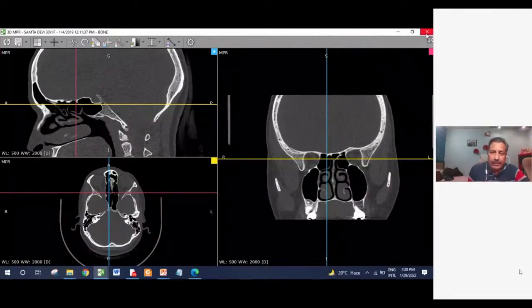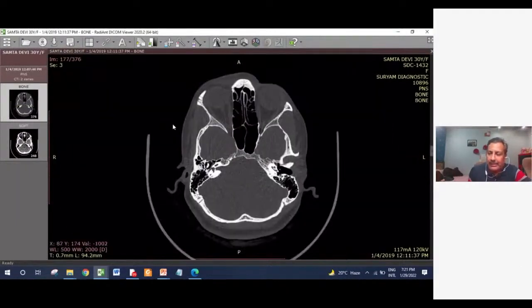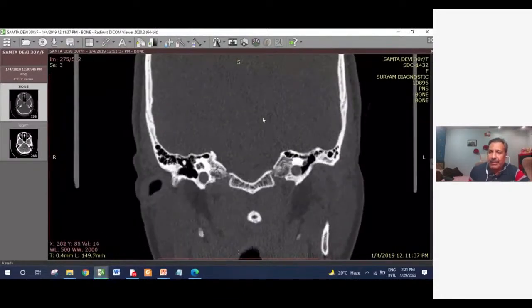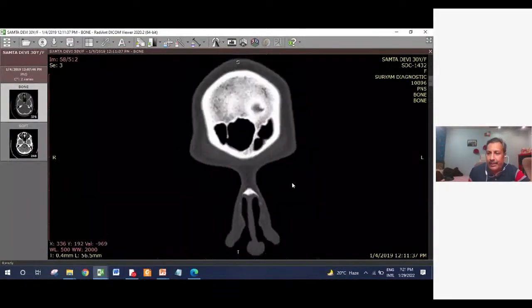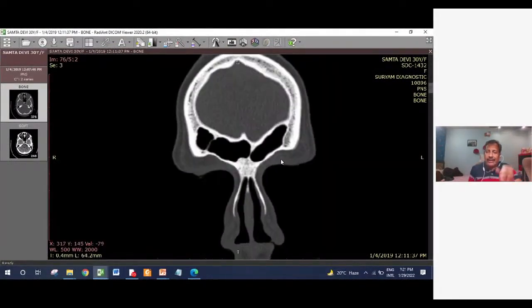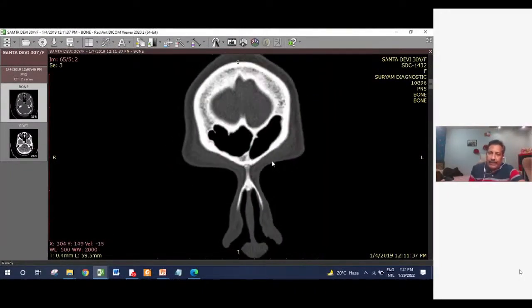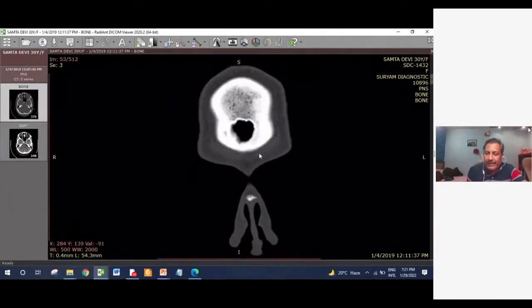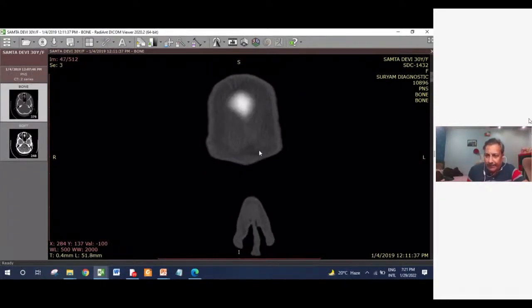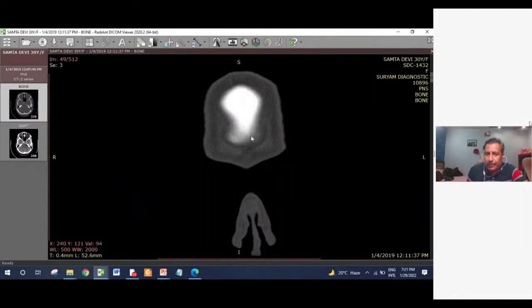So most of the information in radiology of the paranasal sinuses, what you get from a CT scan, we get from the coronal section. Coronal section is easier to understand because we operate in the same plane, and the CT gives you the anatomical orientation in the same plane. Quickly, if I show you what all needs to be seen on a CT scan, right from anterior to posterior, first what you see after the scalp is the frontal bone.